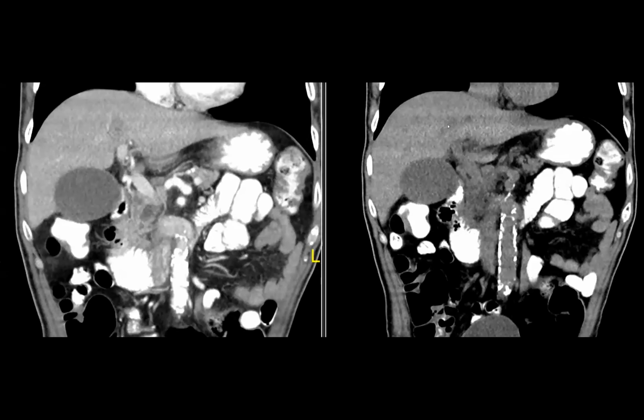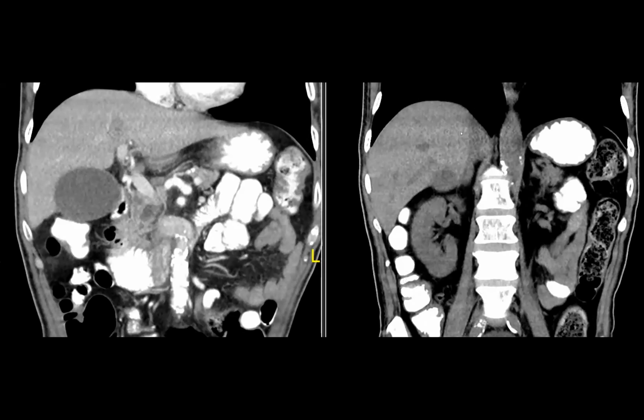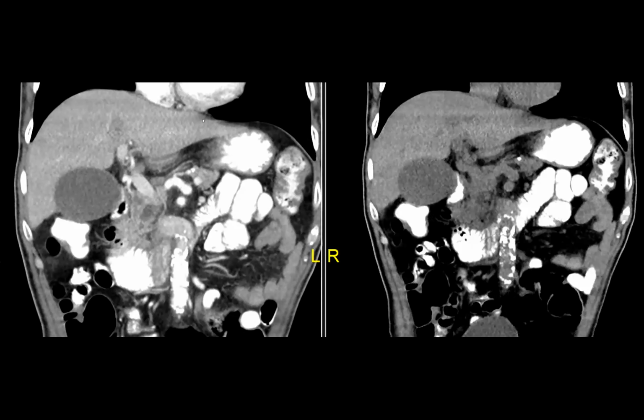But I think this is a very unusual example where pre-contrast really is helpful. In this case, the pre-contrast coronal actually has a beam artifact through it, so it's harder for me to see. But it's an interesting case for that reason: it's a tough case, but here the pre-contrast really helps you. Awesome.